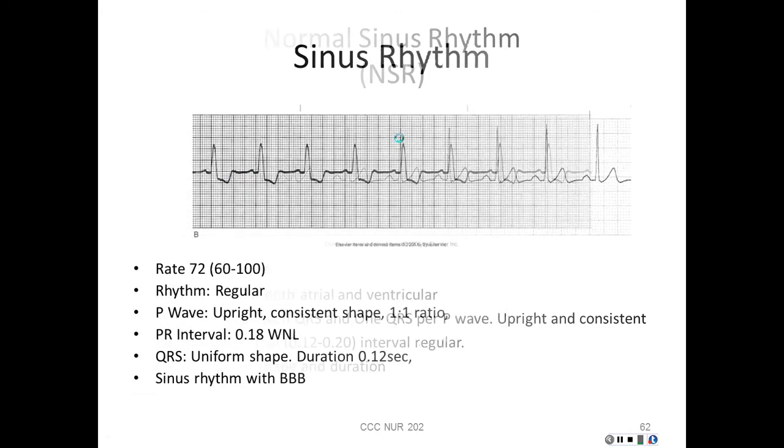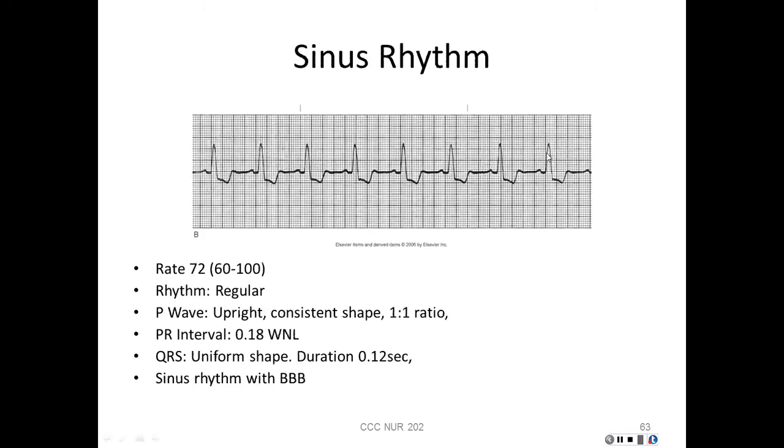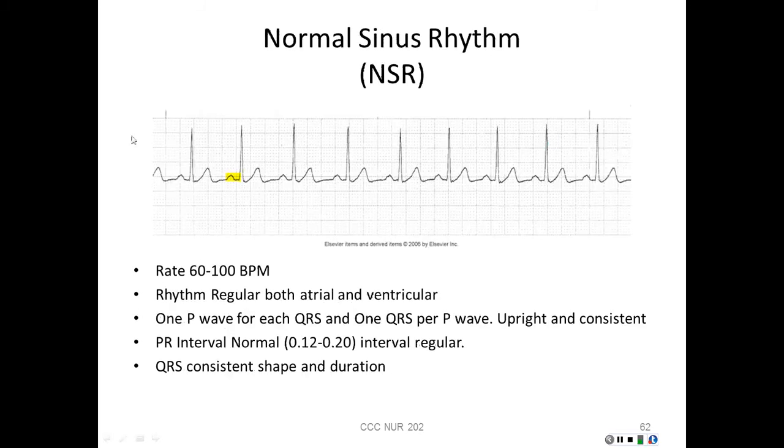We have 8 in there, so we've got a rate of 80 on this strip. Notice that this one falls outside those areas, so it's not counted.